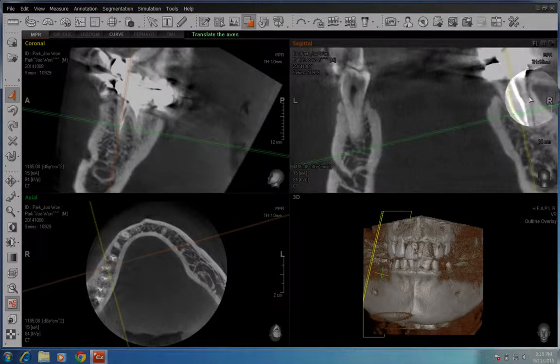If that's the start of a fracture, you would see almost like a blip. If you had a long fracture, a fracture that had been going on for a long time, you would actually see almost like a cavern, like a little oblique or diagonal bone loss right here. And usually it would start at the fracture line and you would see that diagonal bone loss. So that's how you would diagnose fractures.